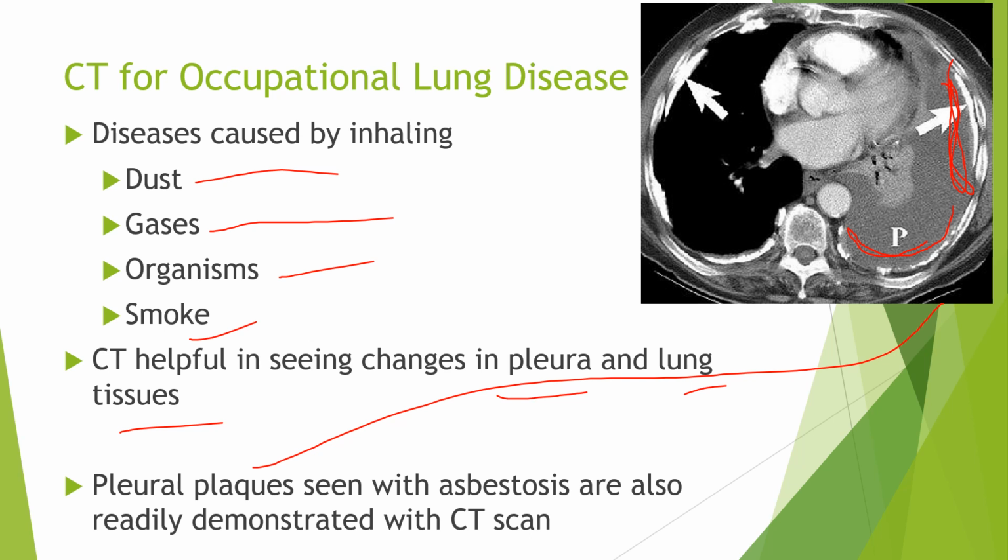So this is a classic case of what's known as asbestosis, right? That's a word I think I used earlier in here. And you can see it a lot easier on a CT scan and a lot sooner than an X-ray. So if they are thinking that they might have an asbestosis, they might order a chest CT versus a chest X-ray, or they might do both.